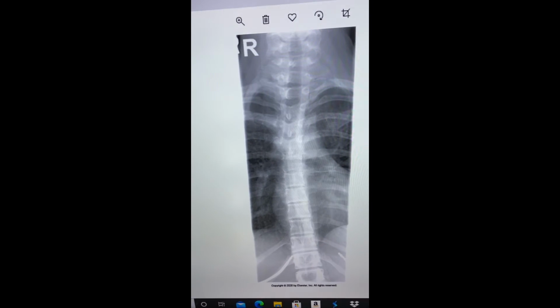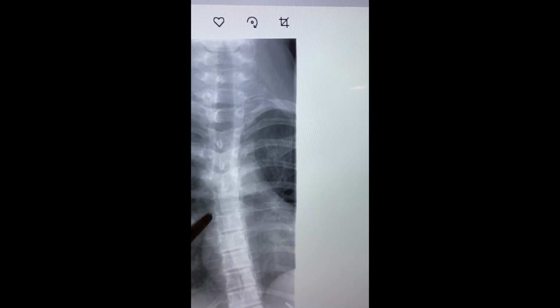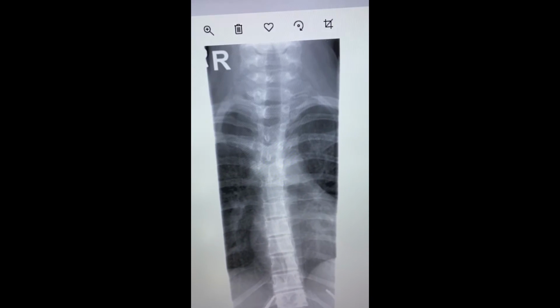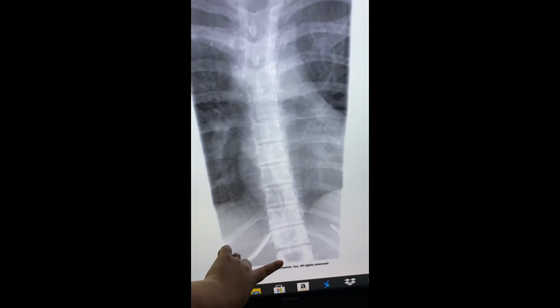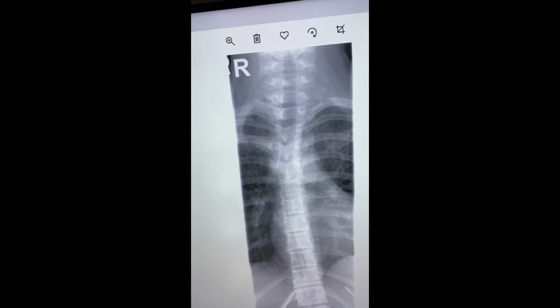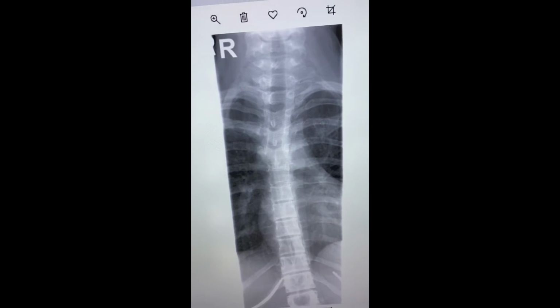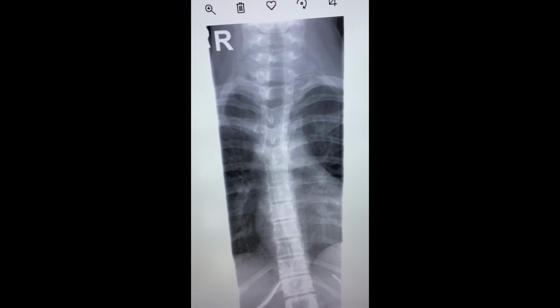Also, we'll talk about centering. So the patient is centered at T6 instead of T7, where they should be centered at T7. You want to have from C7 to L1. L1 is cut off at the bottom of the body. So the patient's required anatomy isn't completely on there. If the patient was centered properly, they would easily have C7 to L1.